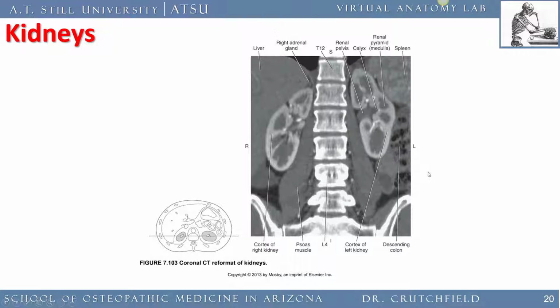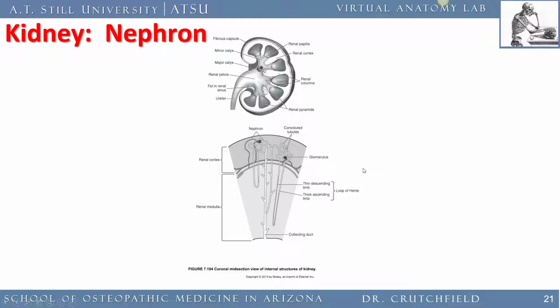Again, another view, mostly looking at the same thing, except instead of being an MR, this is a CT scan, and it's really showing us the same thing. So let's look at where we know all of that physiology you learned takes place. It happens in the renal cortex and in the renal medulla. And up here in the cortex, that's where the nephron is located.